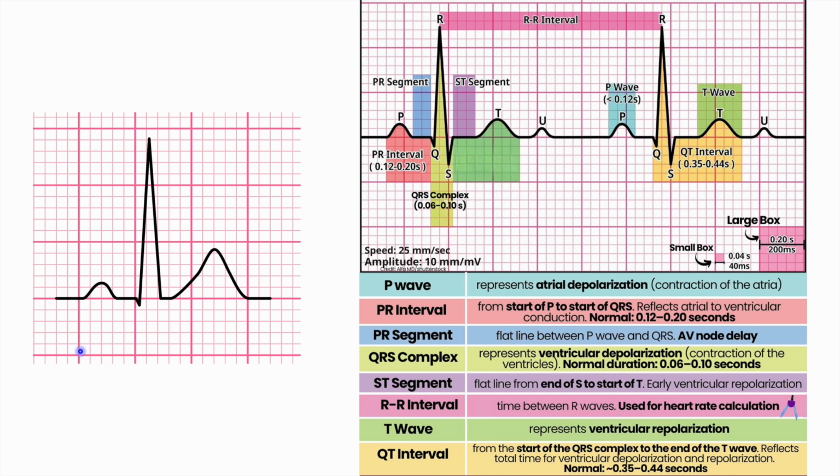When looking at the EKG, I want you guys to generally keep this in mind. You don't have to super in-depth analyze it, but this is the output. You have bump, spike, bump. And what that represents is your P, Q, R, S, T complex. Generally, the P wave is going to be atrial depolarization, and the atrium repolarizes, but it gets hidden under the QRS complex. So you have atrial depolarization, and then you have ventricular depolarization, which is the big QRS spike, and then you have ventricular repolarization, which is your T wave here.